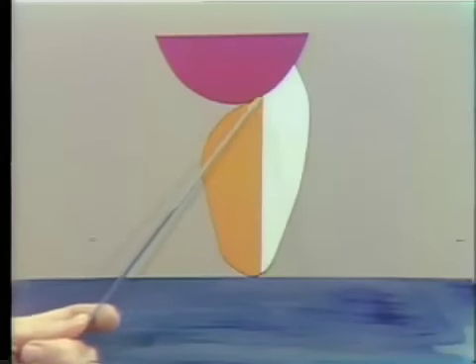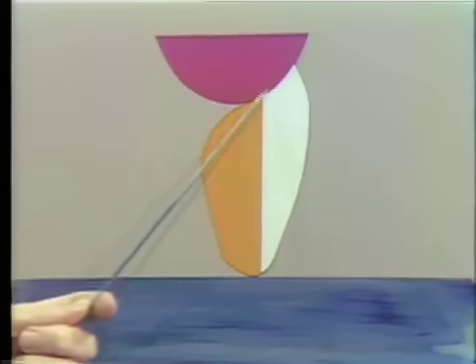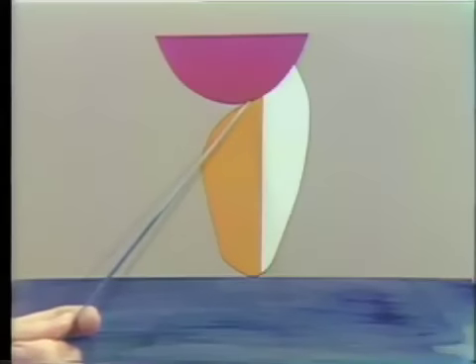This is an important thing to recognize. It's very easy to see it here in an enlarged diagram. It's not quite so easy to achieve in the smaller situation in the mouth, but it's quite critical. Another aspect which is important is in the finishing of the cervical end here, that part of the pontic which fits against the mucosa in this ridge-lap relationship which we've got here.